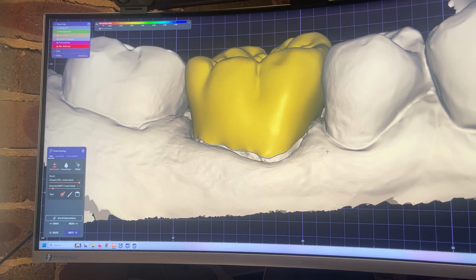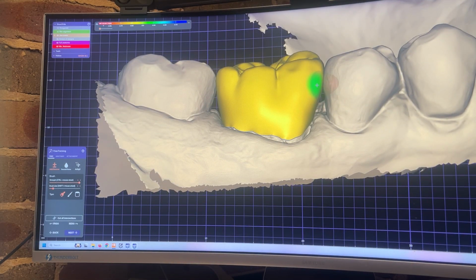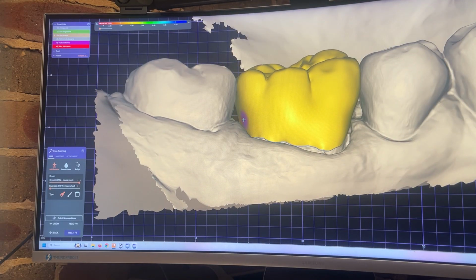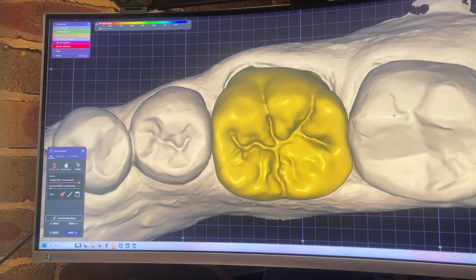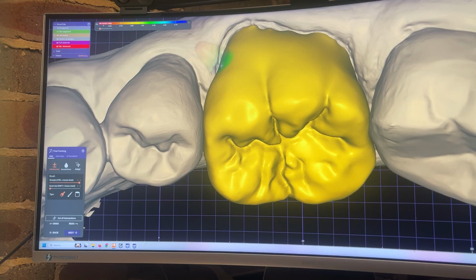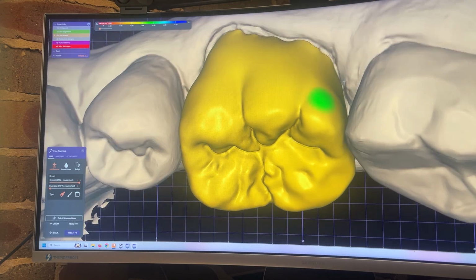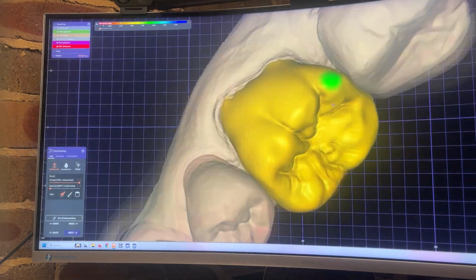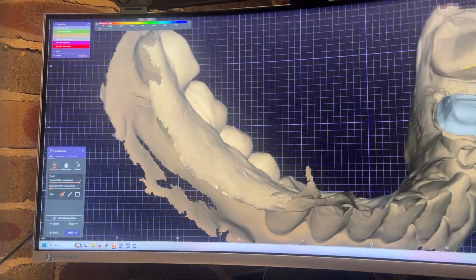There you go. Yeah, some. There you go. So you got that shape there. Bit of a bulge here, goes narrow there. Same here, around about. Yeah. I mean, there's small details no one ever notices and no one ever cares about really, but it's what I see anyway.